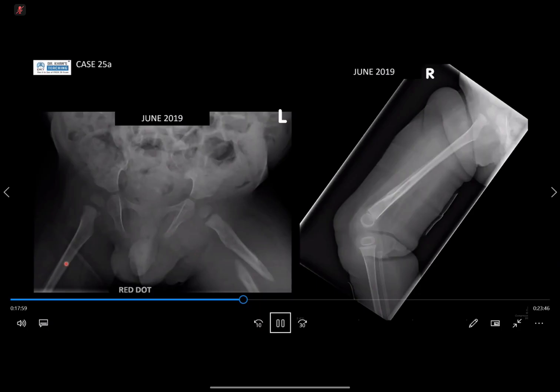He has periosteal reaction on the right side, and it's confirmed on the long leg views. And on the left side, yes, it's probably a more chronic fracture with periosteal reaction and signs of healing. It's displaced and quite separate from each other, which is why it's probably trying to heal but cannot heal. You can see all the soft tissue edema and swelling because of the density of the soft tissues. Okay, so something's going wrong here.